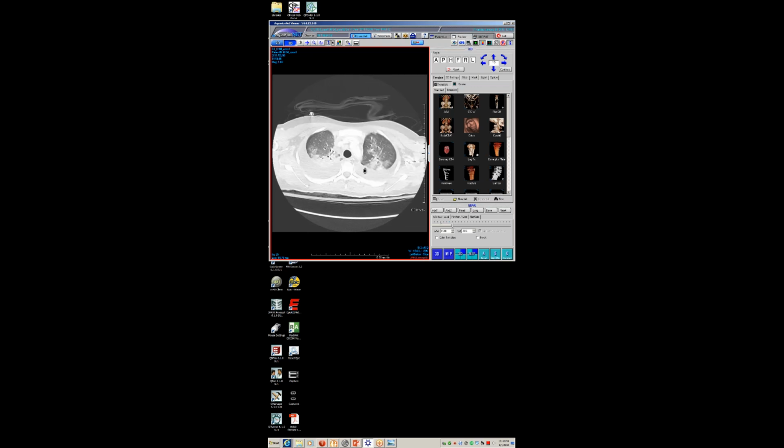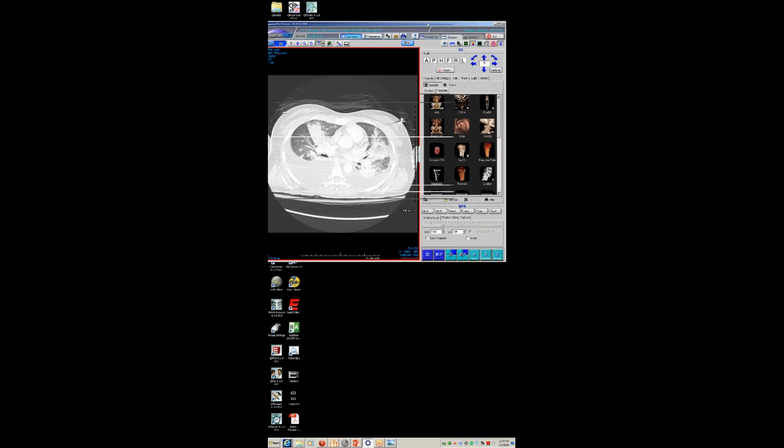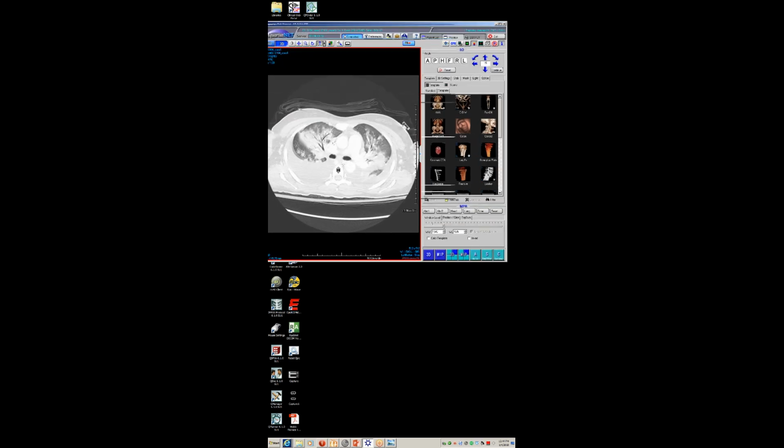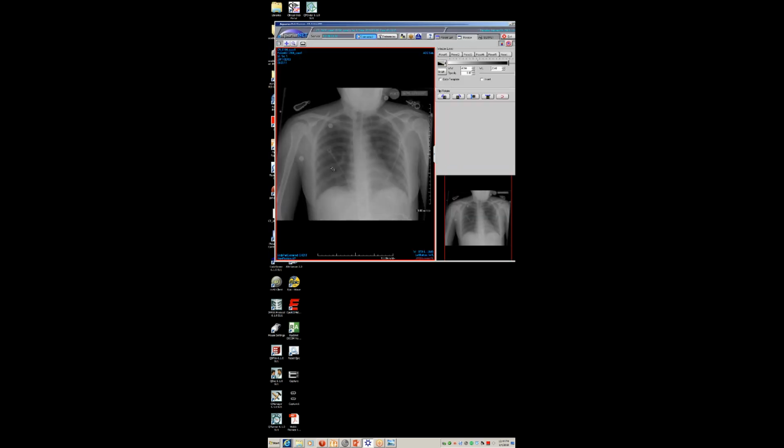She is quite wet as well. And after they made the diagnosis of acute eosinophilic pneumonia, now most eosinophilic pneumonia cases, I think this one has usually a little more peripheral consolidation anyways. Nonetheless, they treat her, and then literally within about 12 hours of treating her with steroids, this is what her chest x-ray looks like. So this is a case of acute eosinophilic pneumonia, unknown cause.